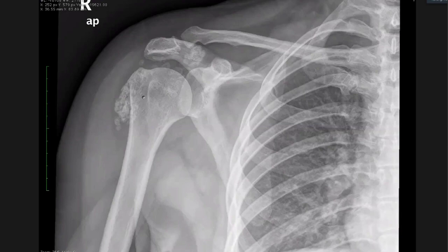So you said primary synovial osteochondromatosis because they are all of uniform size, right? Yes, sir. So what happens in secondary osteochondromatosis? They can be secondary to some degenerative changes. Right. So are you seeing any degenerative changes there? Yes, it's in the acromioclavicular joint. I can see some abnormality, and also around the glenoid, inferiorly, there are fuzzy margins of the bony glenoid.